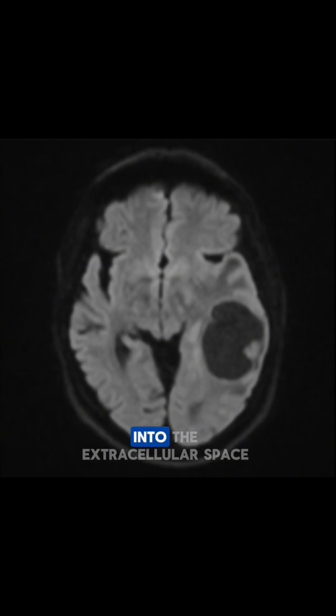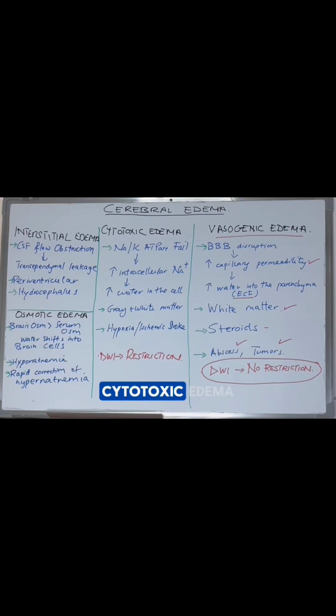In the diffusion-weighted image of this patient with vasogenic edema, blood-brain barrier disruption has occurred. Now, plasma fluid leaks into the extracellular space. White matter is mainly affected because it has a loose structure. Therefore, water molecules move more freely in the extracellular space and there is no restriction of diffusion, as can be seen.